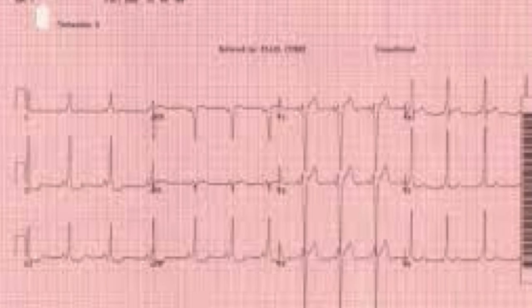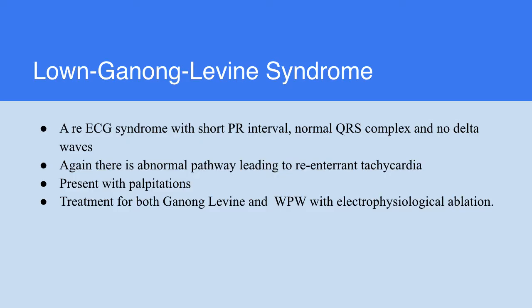This is the ECG. It's showing the short PR interval, the delta wave just at the start of the QRS complex, which is a bit widened. So wide QRS complex, delta wave, and short PR interval, the triad which forms the Wolff-Parkinson-White Syndrome.